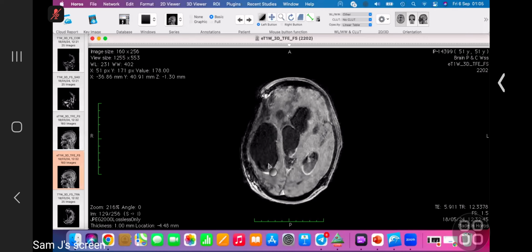These are nothing but layering infective debris within the ventricles, and there is quite a ventriculomegaly. The other thing that you described, there was something here, there was enhancement. Those are nothing but ependymal enhancement and also inflammation extending into the adjacent brain parenchyma.